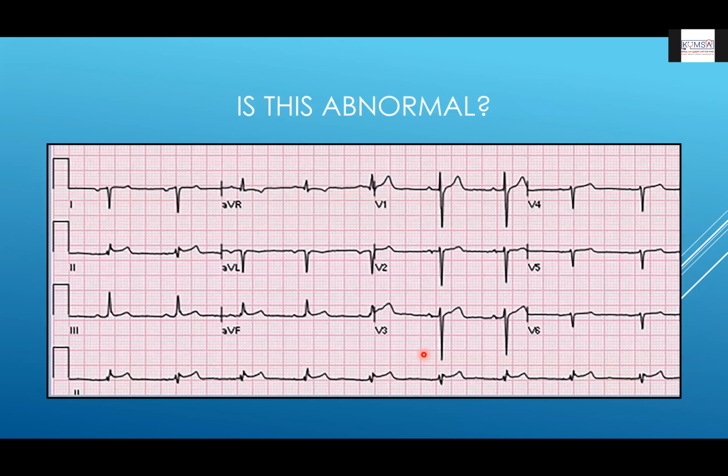The electricity is not going towards the left side. It's going more towards the right. And actually, this is a case of dextrocardia. So that's an interesting ECG for you.